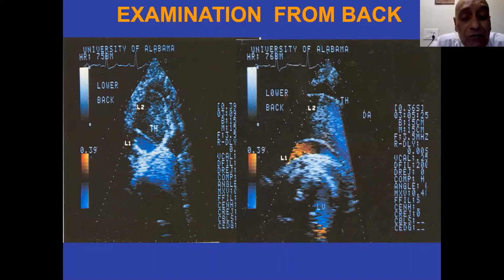The left ventricular cavity is always a clean cavity normally. If you see the left ventricular apex, especially from the fetal echo, we identify the left ventricular apex as clean. The right ventricular apex is actually obliterated by the trabeculations and by the moderator band. Thank you. Any other question?